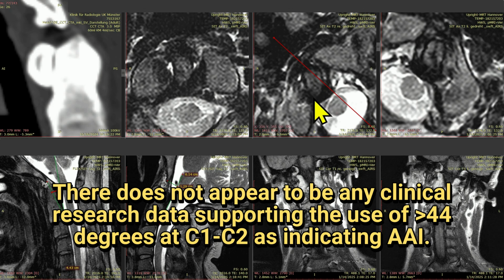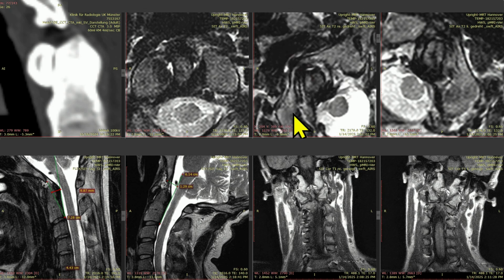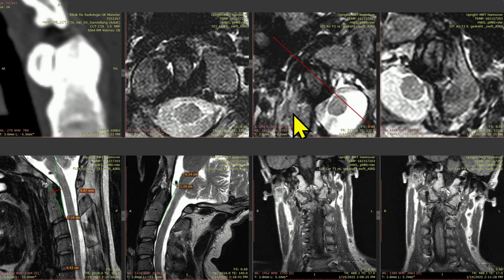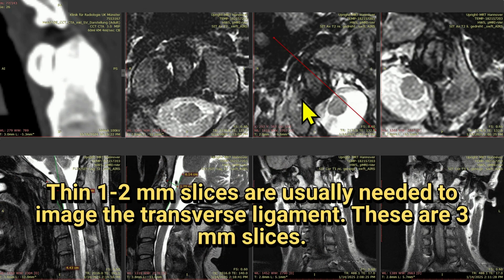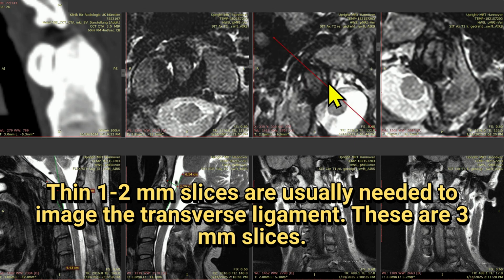But here we tend to see that the transverse ligament looks a little thinned. And there's fluid in the upper cervical bursa, so it looks like this could be a small tear here. Now, the problem is that we don't have thin slices here, but again, it looks like there could be a transverse ligament issue here. Looks like there could be a transverse ligament issue there. So we're seeing it in at least two slices, which is helpful.